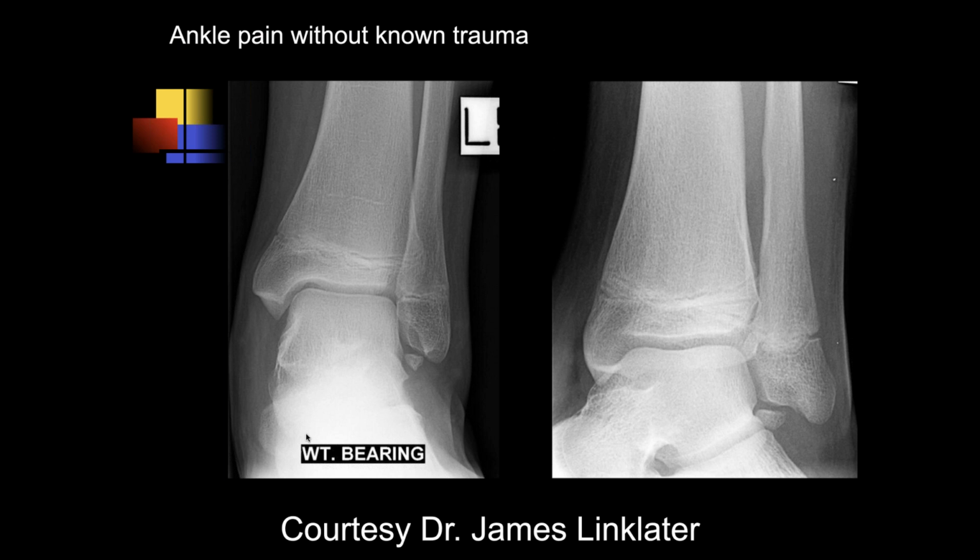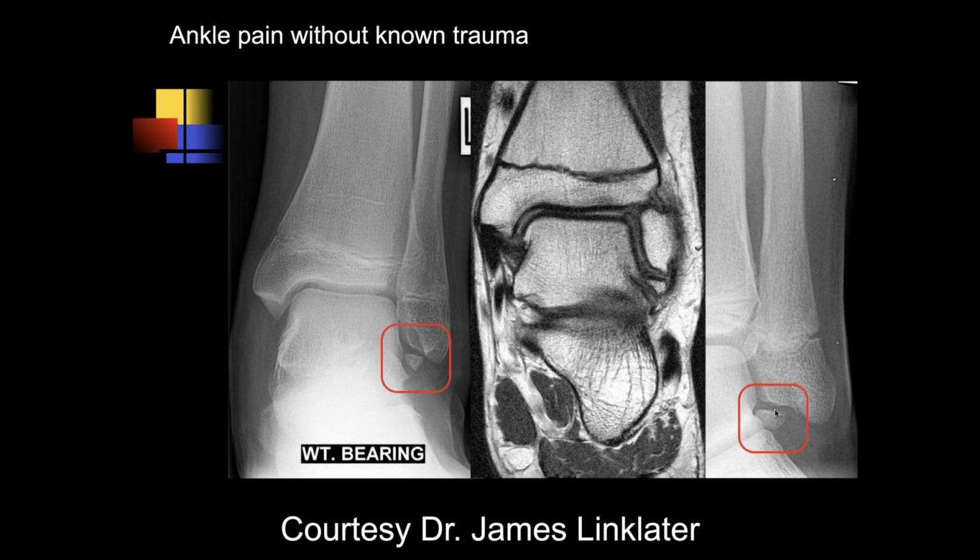Ashu. Okay, we're looking at two radiographs here. I do see a well-corticated fragment off of the lateral malleolus, just inferior to it. Without known trauma, still thinking about a prior avulsion fracture that's well-corticated, maybe remote. Not in a kid, no. Oh, yeah, I think that's congenital.